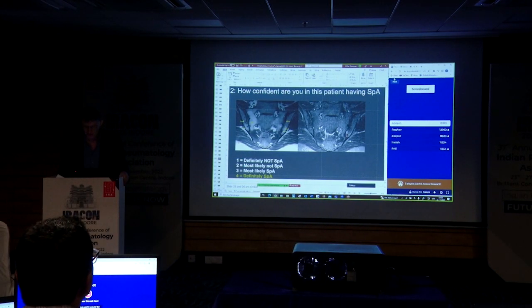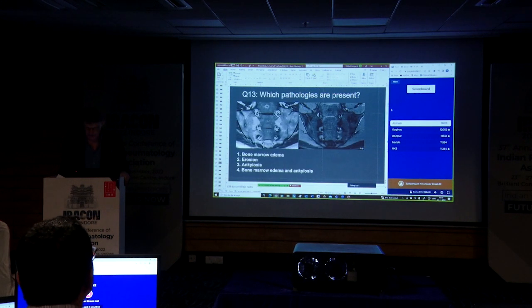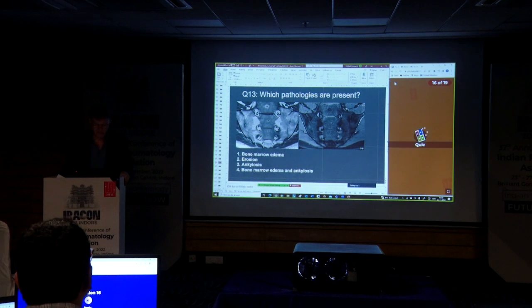So it should be a little bit unreasonable sometimes. That's how life is. So next question here is, what is present here?